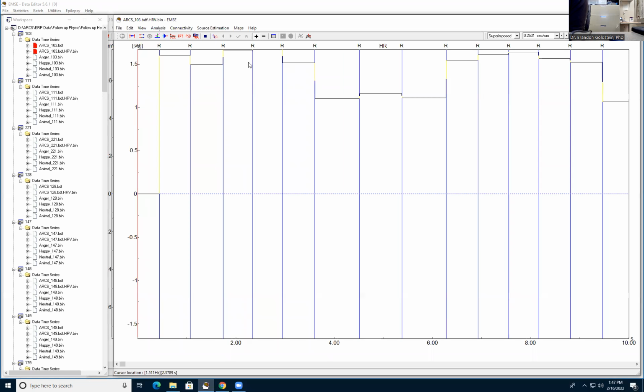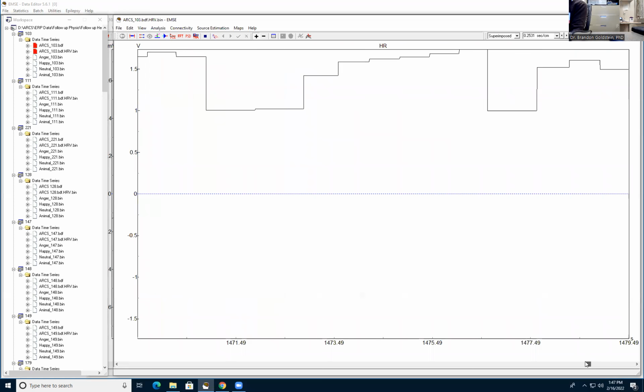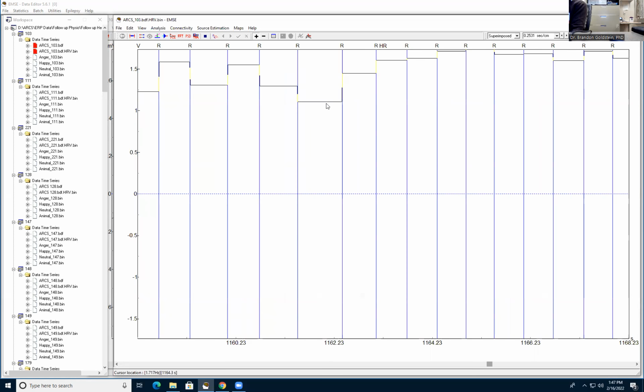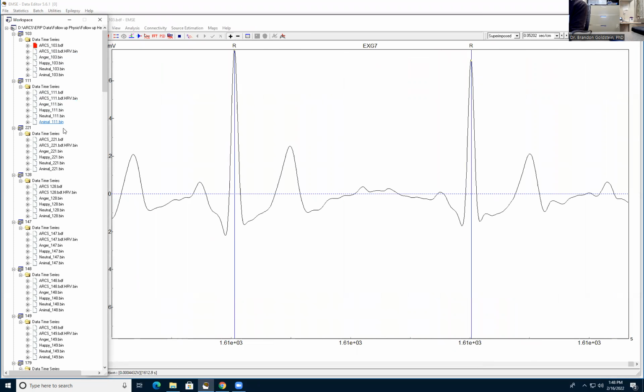Basically, what this is doing is it's showing you like this. You can kind of think about this as time in between each one of these peaks as they're unfolding across the study. And it does kind of have this sort of boxy shape to it, and that's fine. That's normal. It's supposed to look like that. But honestly, you don't really need to look at this, but you do need to have this file loaded in for every single person.